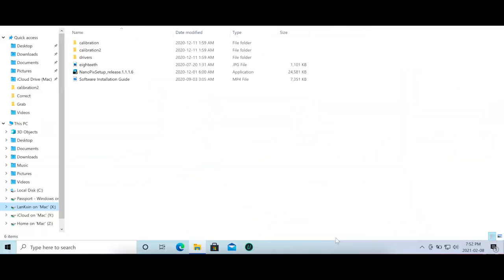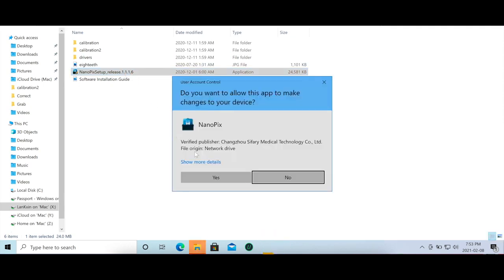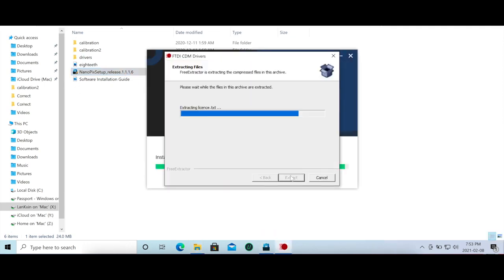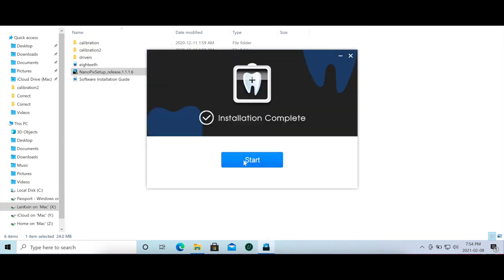Okay, let's get started with installing the software. After connecting the USB key, you can go ahead and click the installation application. This program is super small, and honestly, it's as simple as 1, 2, 3 to install by yourself. The installation takes only about 3 minutes, and then we're ready to rock. All right, and now we're done.